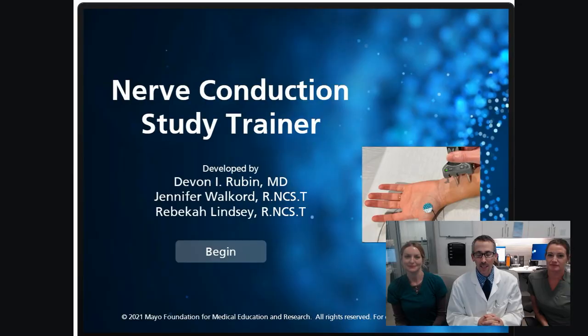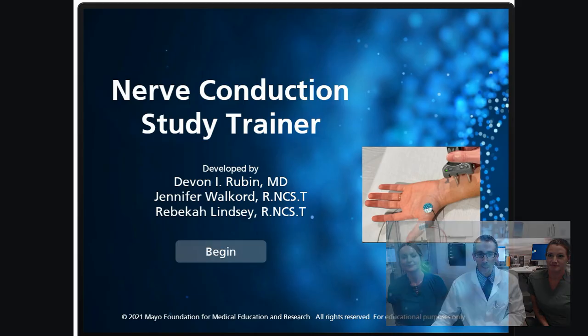And we're here to introduce you to a new interactive educational program called Nerve Conduction Study Trainer that's designed to teach you the concepts, the methods, and the interpretation of nerve conduction studies. Let's take a look at this new product.